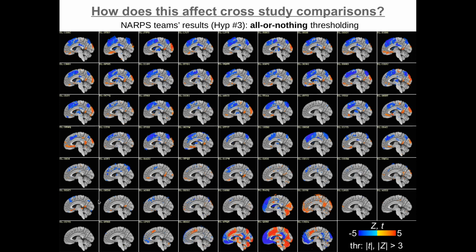Empty, empty, empty here. And now, if I look at this, I might say, well, maybe a third of the results really agree with themselves, but then a lot of them start looking very different. There's a lot of variability here. We have a reproducibility crisis. That might be one way that I would interpret these results.